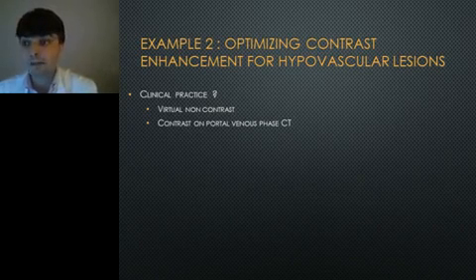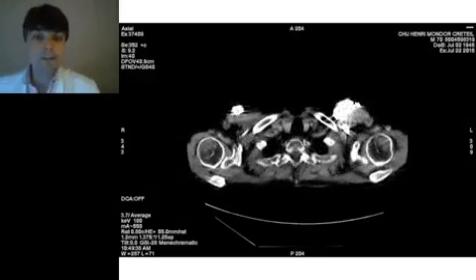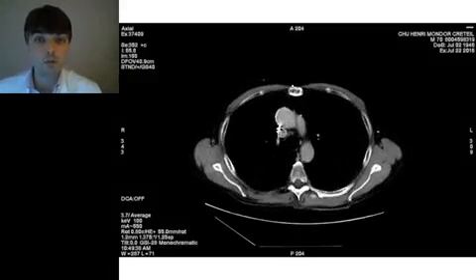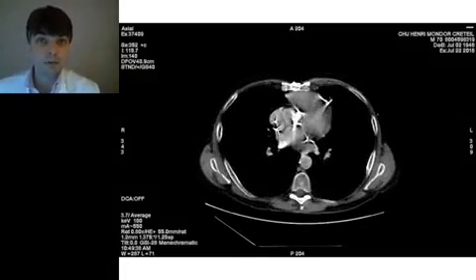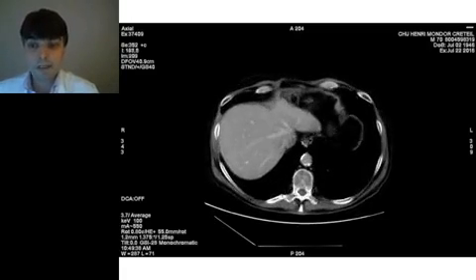Again, in clinical practice, different approaches. One way to go is to reduce the keV, again starting from the 100 keV images. So this is, again, a reduced contrast situation as compared to what you're used to in the polychromatic 120 kVp usual setting of abdominal imaging in adult patients. Now you have a reduced contrast here, and you can see the images.